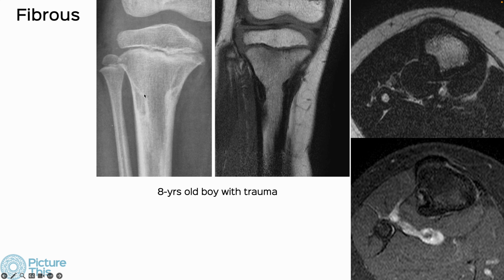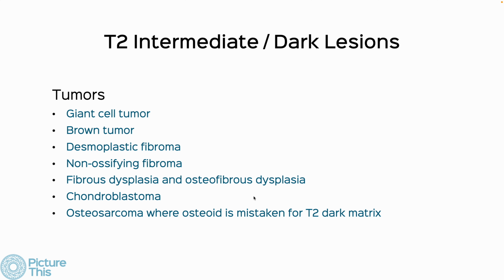Here's an 8-year-old boy who had a football injury, then they got the x-rays and these focal non-ossifying fibromas were seen. The MR had been done initially just for the ligaments, and then these were T2 dark, and somehow the radiology report did not emphatically say that these are non-ossifying fibromas and nothing further needs to be done. I actually biopsied this because of the helicopter parents going completely berserk when somebody said that there are tumors within the tibia. But everything's dark. So T2 dark, STIR dark. This is classic fibrous tissue and therefore non-ossifying fibroma.